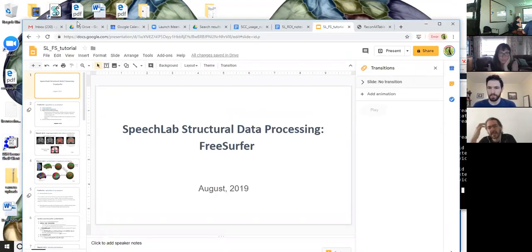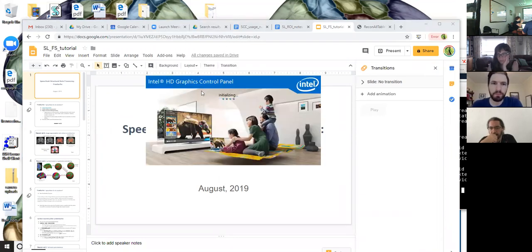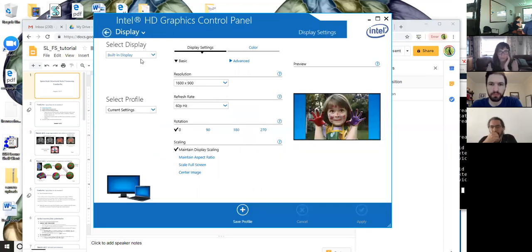Well, but you don't have the suprathreshold. Do you have suprathreshold results for every individual subject? So that's what I'm not sure. So that's why I'm not sure if I should look through the ROI file or if I should really just create some sort of mask of the areas that I want to look at and look at the whole volume, but with that mask. Like I'm not sure which angle to go down.